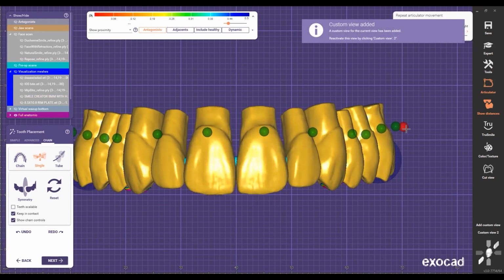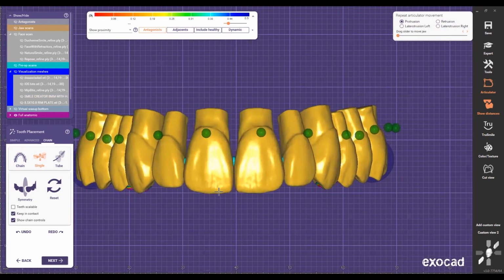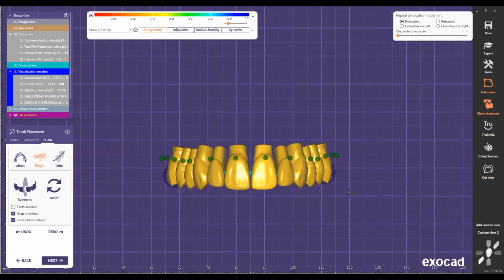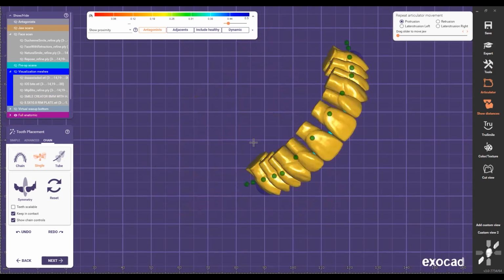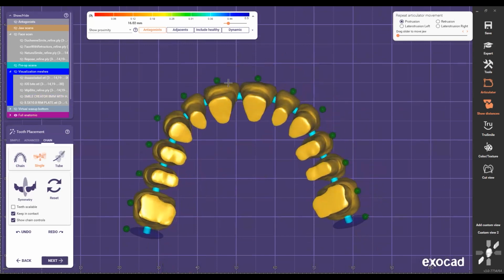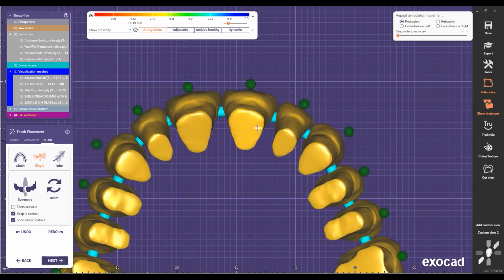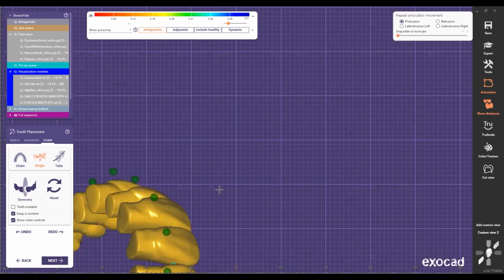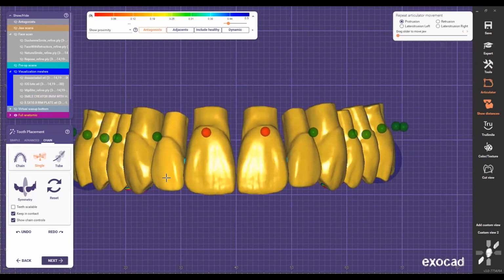So from here, I'm going to start setting up like a denture setup, right? I'm going to give the proper angulation of the teeth. I have my 8 and 9 in proper position, and I check everything right there. Everything looks beautiful from the top. And that's something you can see in how dental technicians set denture teeth. They put their fingers on the teeth, go side to side, and you can apply those techniques here to help you. So now I can see the inclination of the teeth right there, and I just lock it. Then by default, I'm gonna keep this one at least 0.5 millimeters shorter than the incisal.